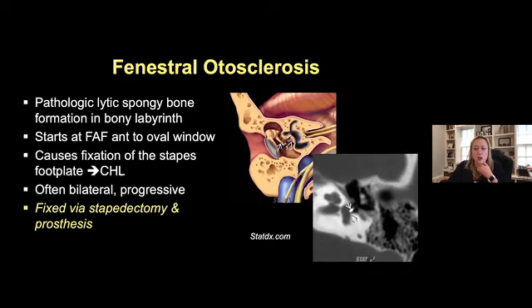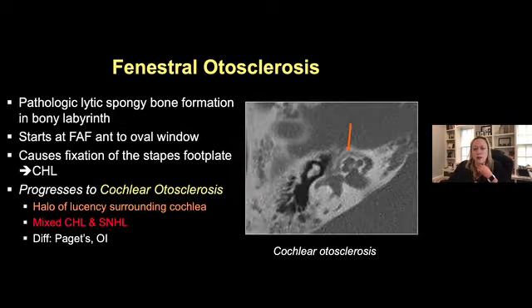It's fixed surgically by resecting the stapes or doing a stapedectomy, and placement of a prosthesis, a little piston that is stuck onto the incus. Then they fracture the footplate and put this piston in to repair the fixed stapes. And this is a case from StatDx.